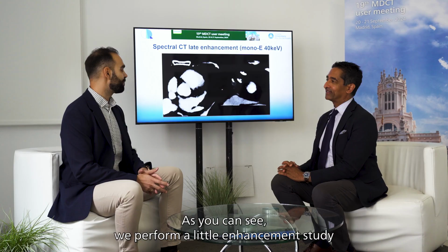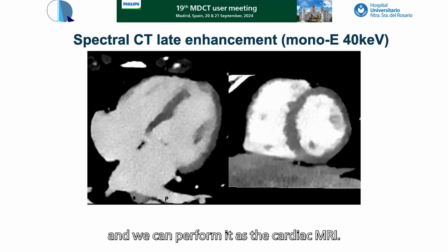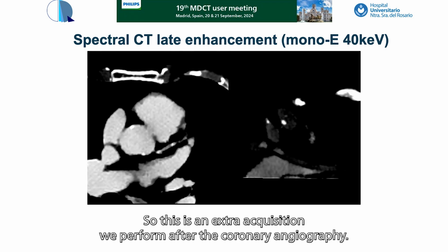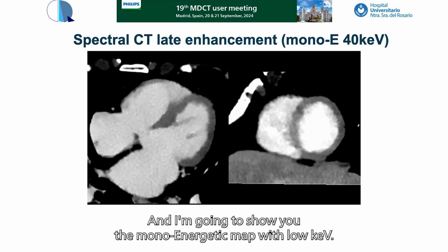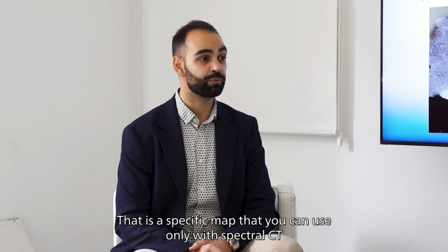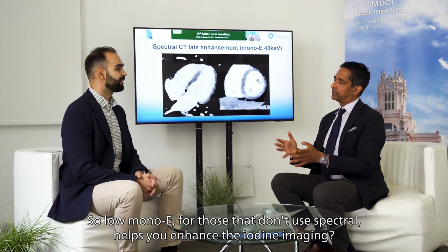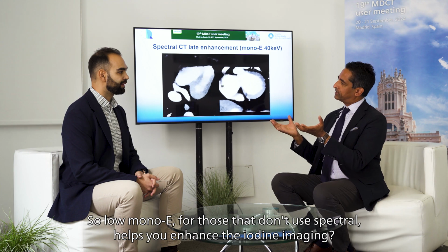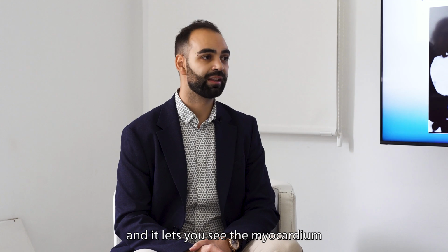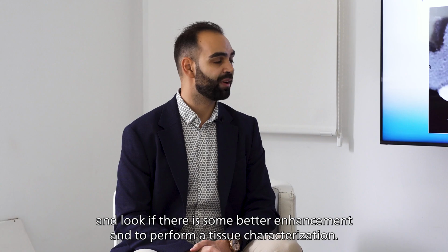Exactly. As you can see, we perform a late enhancement study, and we can perform it as in cardiac MRI, but we use iodine. So this is an extra acquisition we perform after the coronary angiography, and I'm going to show you the monoenergetic map with low kiloelectronvolts. That is a specific map that you can use just with spectral CT and can improve your contrast resolution. So low mono E, for those that don't use spectral, helps you enhance the iodine imaging? Exactly, and improves your contrast resolution and lets you see the myocardium and look if there is some late enhancement and perform a tissue characterization.